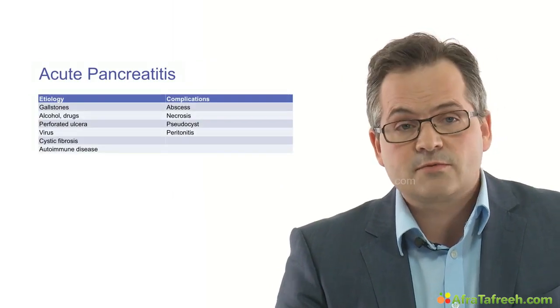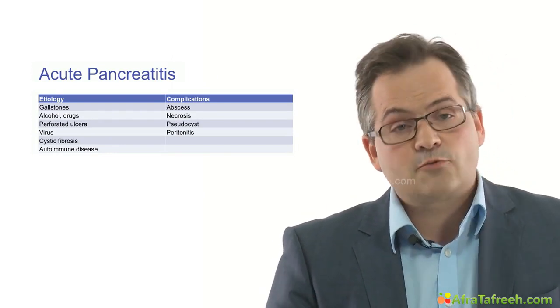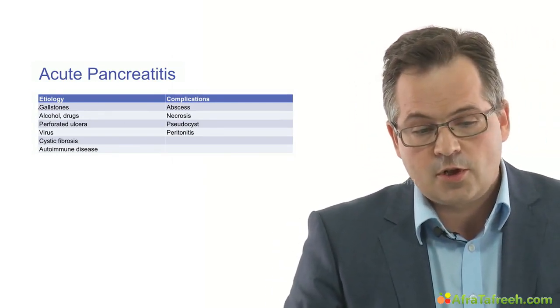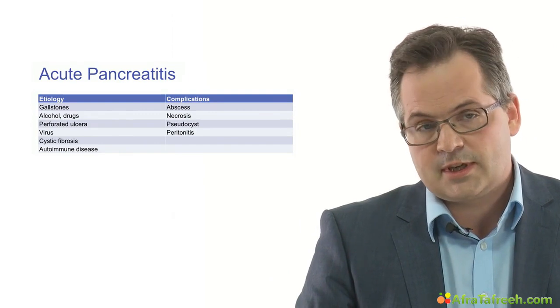So what are the reasons? What is the etiology of pancreatitis and what are the complications? Therefore, ultrasound is the right tool to search for the etiology. We can find gallstones or go for cysts and necrosis. We can also detect this.